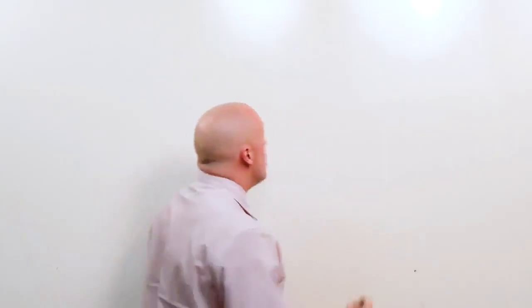So as you go through this video, I want you to also look in your notes where we have typical presentations of what an EKG will look like for each of the different arrhythmias. Pattern recognition is key. Let's go through arrhythmias.